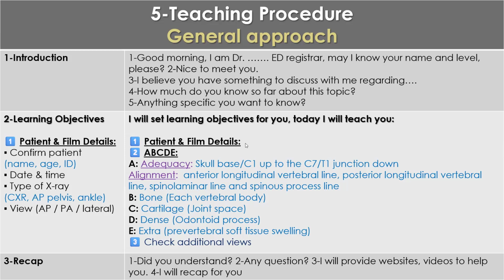You can see the slide, doctor? Okay, so do you find the number 4 here? No, sir. Okay, so patient and film details, ABCDE system or ABCDE approach, then check additional views. Easy? Then you will talk about patient and film details.